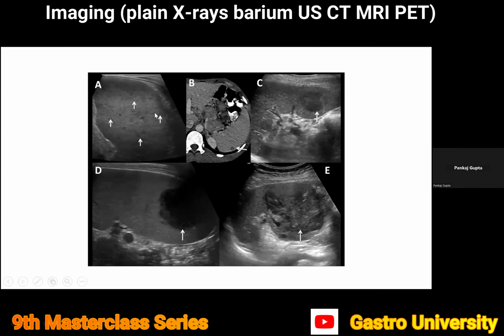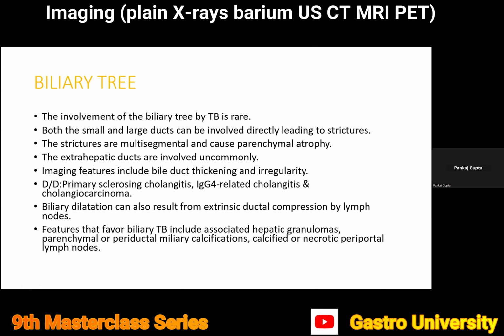Splenic tuberculosis again presents in a similar way with micronodules. Again, these are very well seen on a high resolution ultrasound compared to CT. And another example where we had just one lesion in the spleen, a case of macronodular TB. This was a case of splenic tubercular abscess, a large lesion in the inferior pole. This was a rather interesting case, a patient with acute pancreatitis in whom we incidentally detected a splenic lesion. We performed CEUS and thought it was a case of hemangioma, but as the patient was symptomatic, we performed an FNA and a diagnosis of acid-fast bacilli positive TB was confirmed.